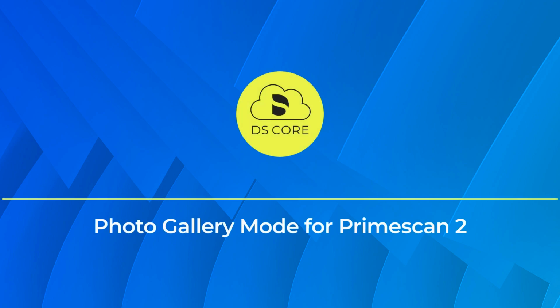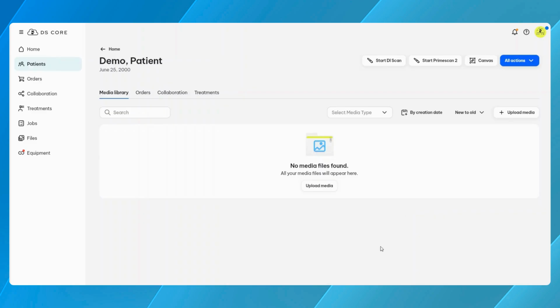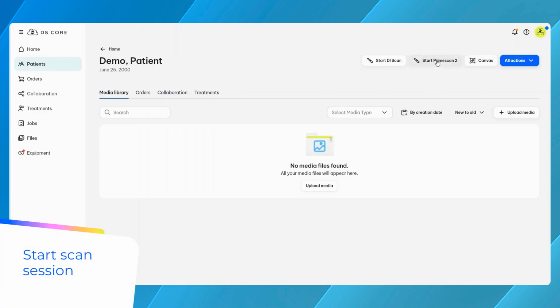Discover Primescan 2's new photo gallery mode on DS Core. Let's begin by launching a scan session with Primescan 2.